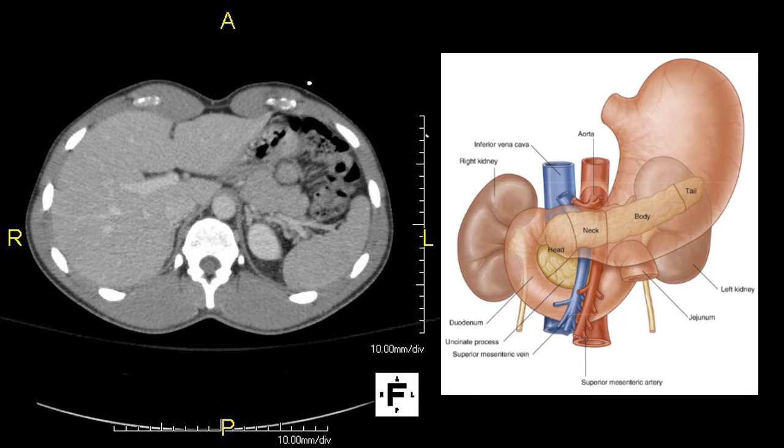If you haven't figured it out yet, our new landmark is the left kidney coming into view. The picture on the right shows the orientation of the left kidney posterior to the stomach. In most cases, the left kidney lies more superior in the abdomen compared to the right kidney. Let me just trace out the left kidney for you on both of these images while we're here.